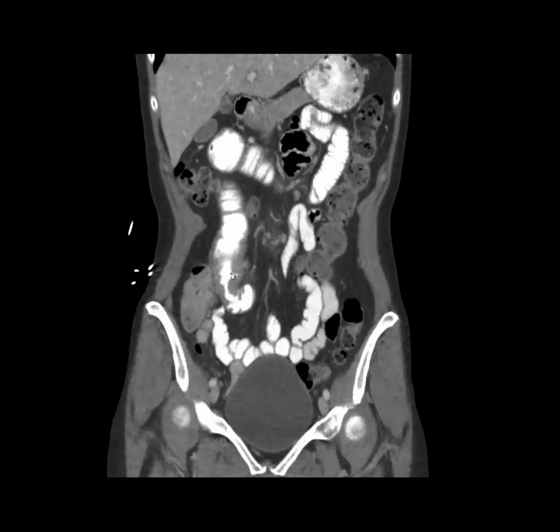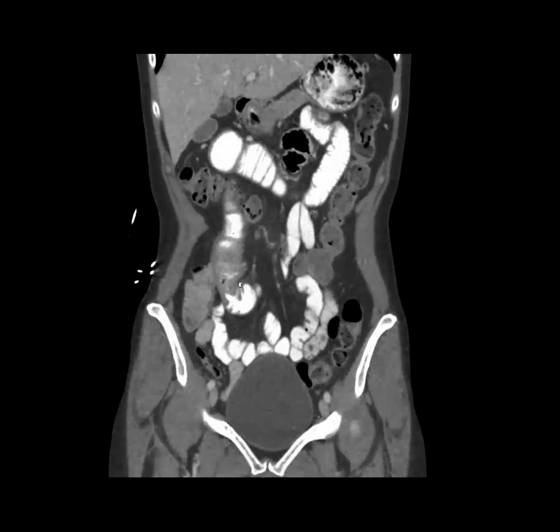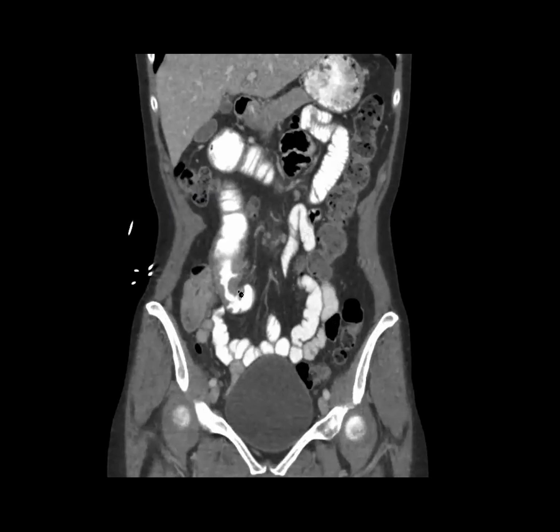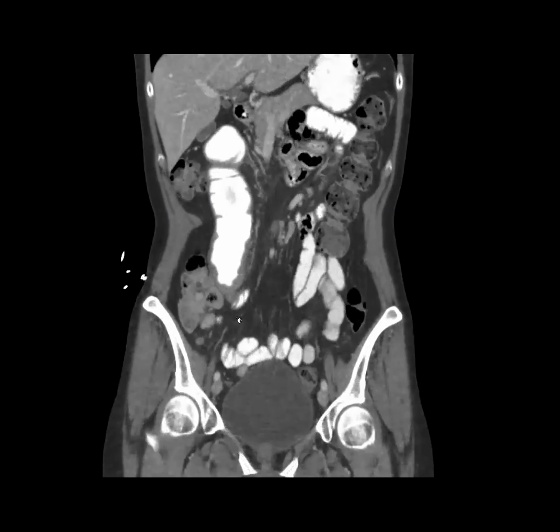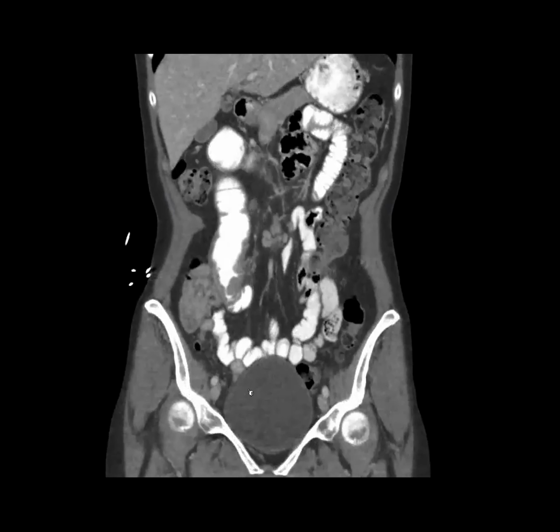And then we thought this was probably an adenocarcinoma. They went for resection, and this actually turned out to be a lymphoma. The patient then got a PET scan, and there were no other sites of lymphoma except these lymph nodes, which were all resected also, and they also had lymphoma in them. But this was basically thought to be a primary GI lymphoma. So I thought this was interesting. I hadn't seen it, and it wasn't aneurysmal dilation like we normally see with lymphoma.